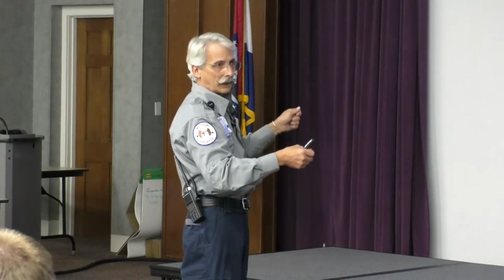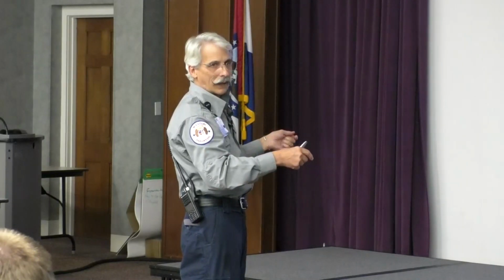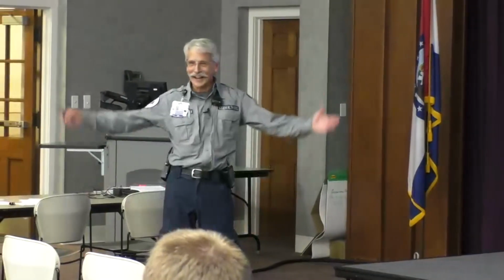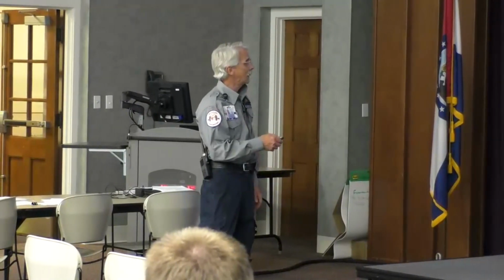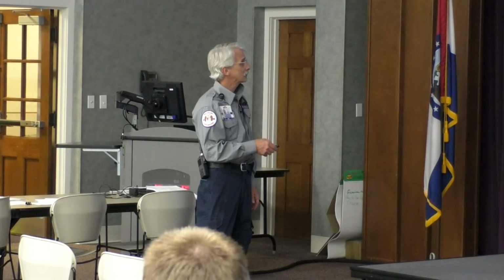If instead it went up, I would push my blinker up and it would be a right bundle branch block. I don't know how much more simple you can get than that. Can there be rabbit ears? Absolutely.